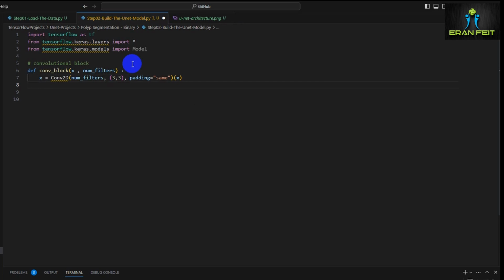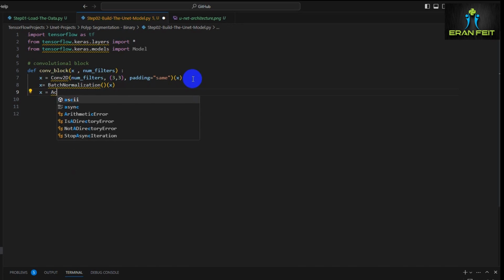So please follow this code, and as you can see, we are creating layers where each layer builds over its previous layer, and each layer is combined with a convolutional layer, a batch normalization and a ReLU activation function.